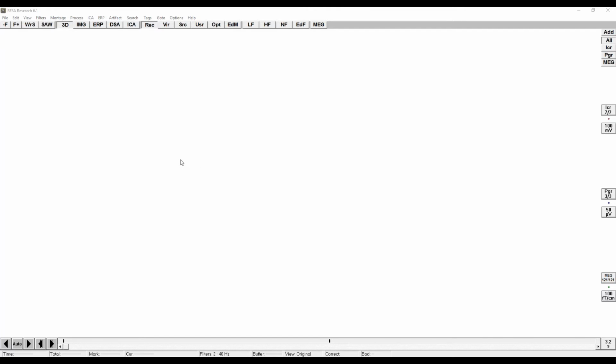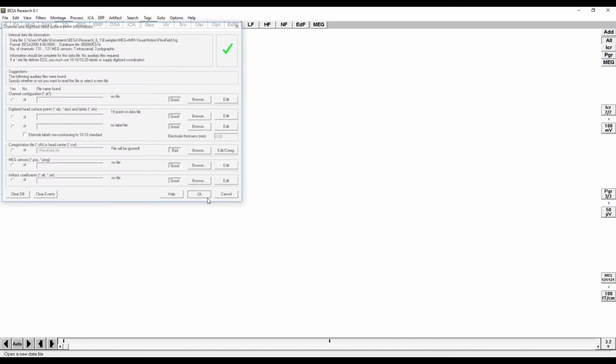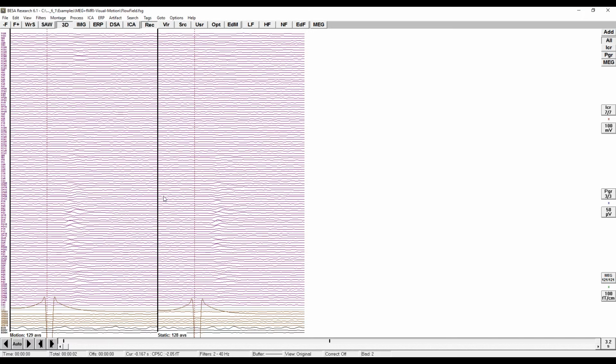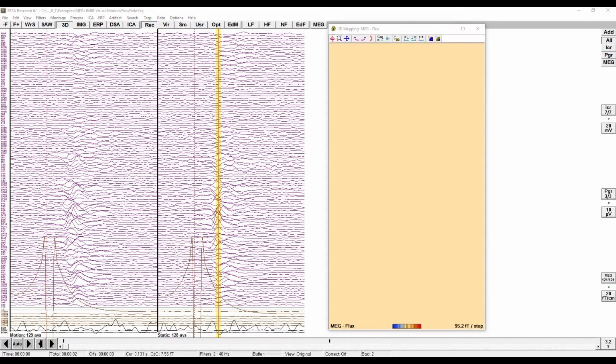And so I'm going to start with an MEG example. In this experiment, the subject watched a screen and there was a static random field of dots, or the random field of dots moved towards the subject. So we had two conditions, one called motion and one called static. We can see these two average conditions here, left and right, and I can get a map of my data.